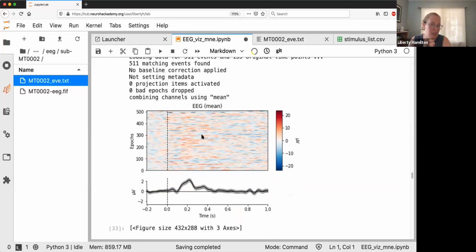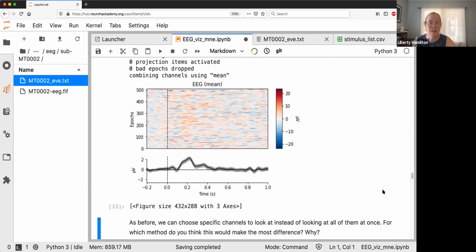So for our experiment, that really might not be what we want to do. This is the zero onset of a sentence. And so you can see there's a little bit of this N1 P2 type complex. Because it's speech, it does look quite different than if you had an auditory response to something like a click, which would look very nicely sharp and defined. This is just the nature of continuous speech data. With different types of speech sounds, it's not going to be as tight a response.